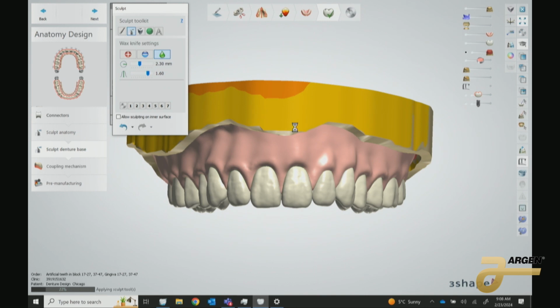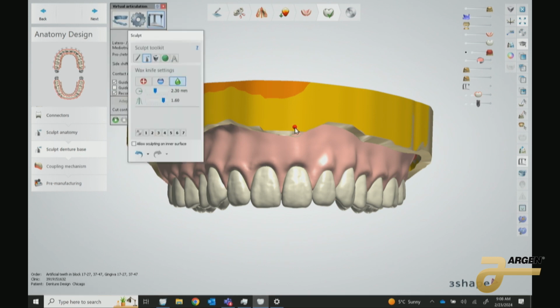Now in 2022, the 3Shape software for 2022, there were some updates made to how they bring the wax up in. If you're in an older version of 3Shape in your lab, the wax ups don't come in quite as nice. You do have to do a little bit more touch-ups and build-ups. The 2022 is pretty good, but it's still not accommodating for all of our functional limits, so we still do need to do some editing. So I'll show you that here.